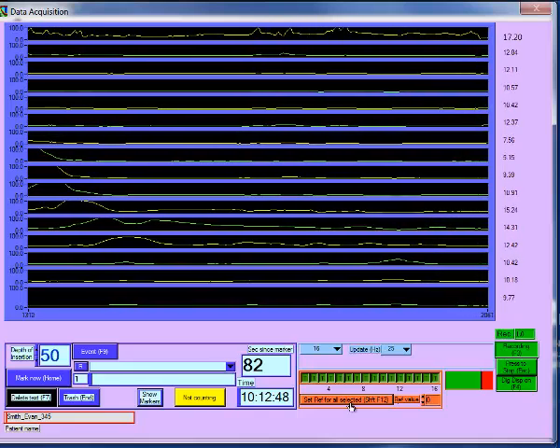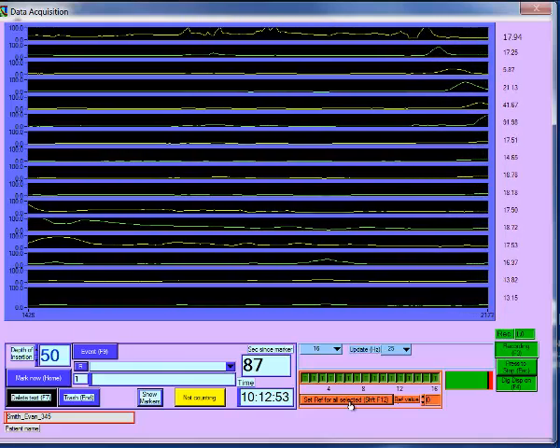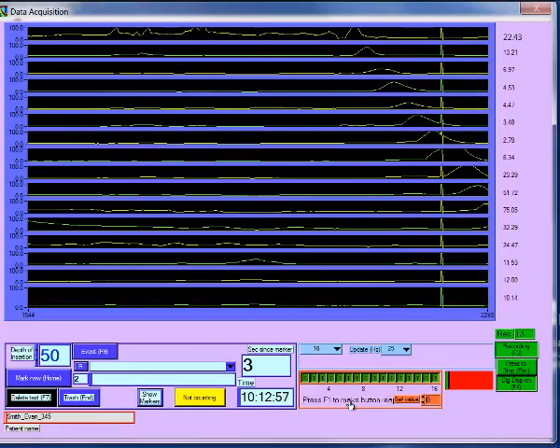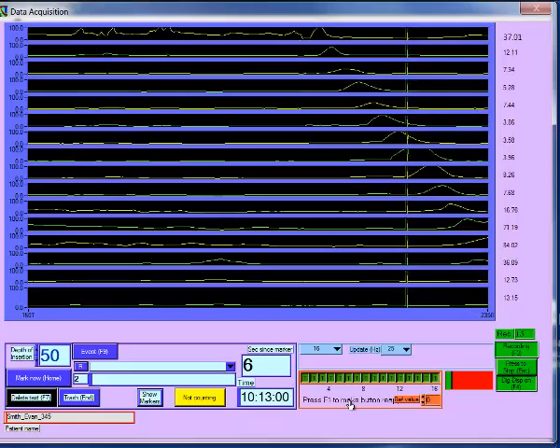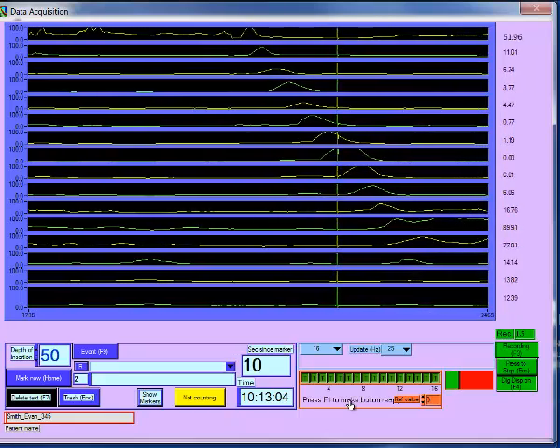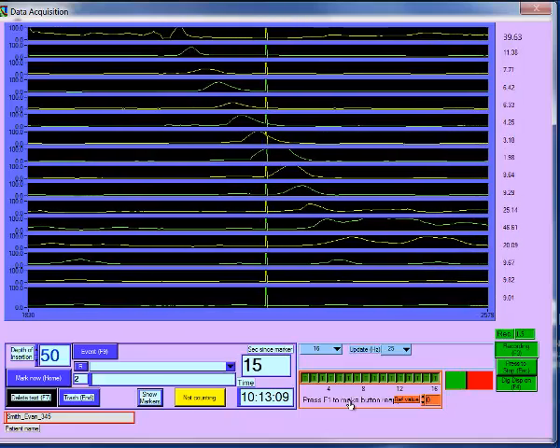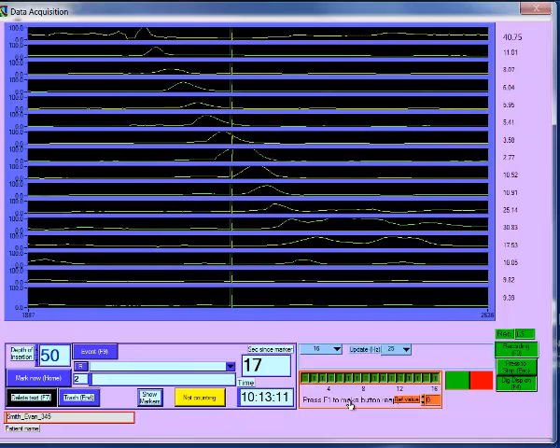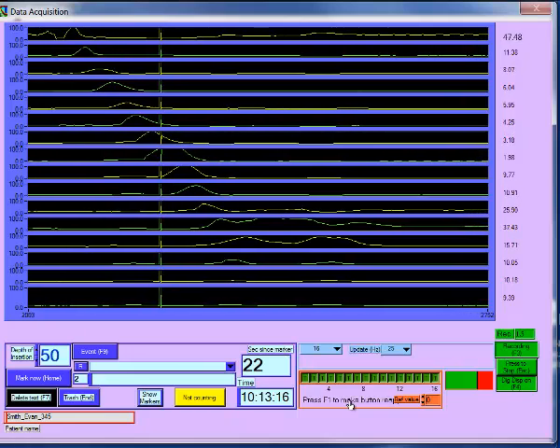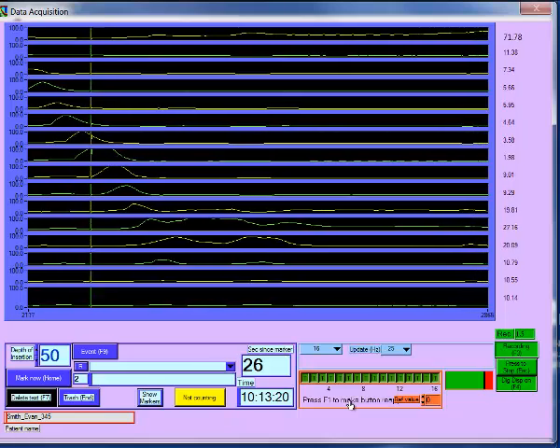Press on the button marked Set Ref for all selected, and the digital values should change to 0. They won't in this example because of the data that is coming in. Check that the values are stable and that they move when you lift the manometric catheter up. If they are unstable, there may be a bubble in that channel of the catheter, and if they do not rise when you lift the catheter up, that channel may not be perfusing, or there may be a problem with your calibration.